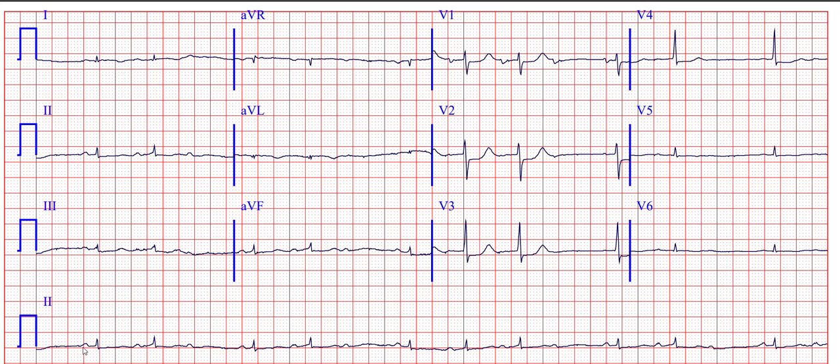Here, what is the PR interval? You can say 200 milliseconds, but here it is more than 200 milliseconds. If you take this much into account, definitely it is more than 200 milliseconds. So this is like the Wenckebach phenomenon. Here the PR interval is increasing gradually and then there is a sudden drop. So this is 3 is to 2 Wenckebach phenomenon. 3 is to 2 means there are 3 P waves and QRS is only 2. So this is called 3 is to 2 Wenckebach phenomenon.